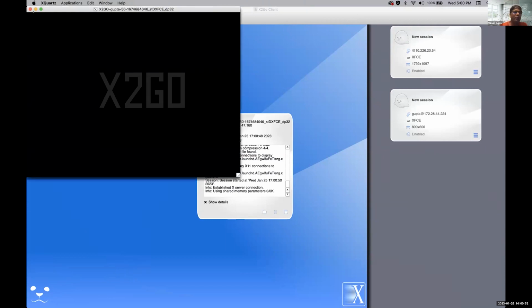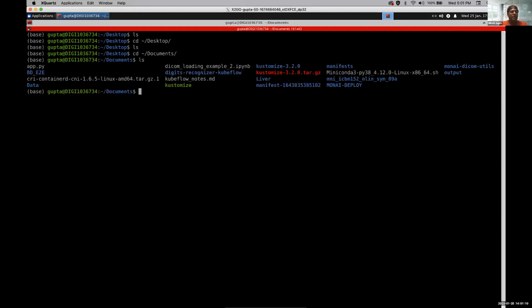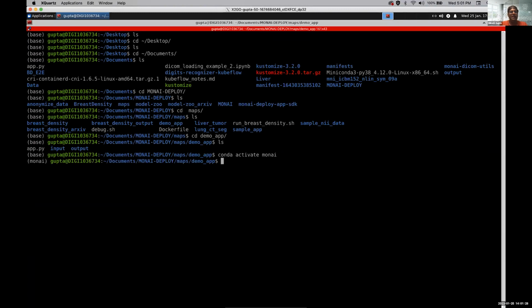Let me try to show, I won't do any live coding, but I will run through some code so you can get a sense of what I'm talking about. I have not run this code.